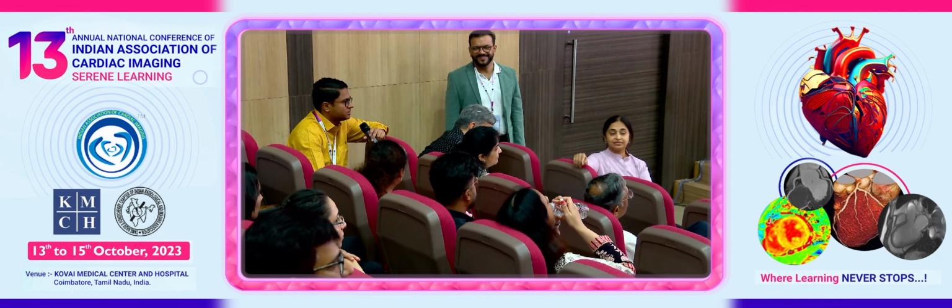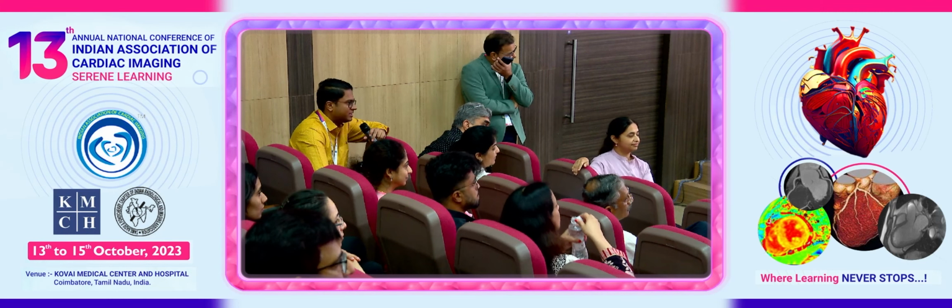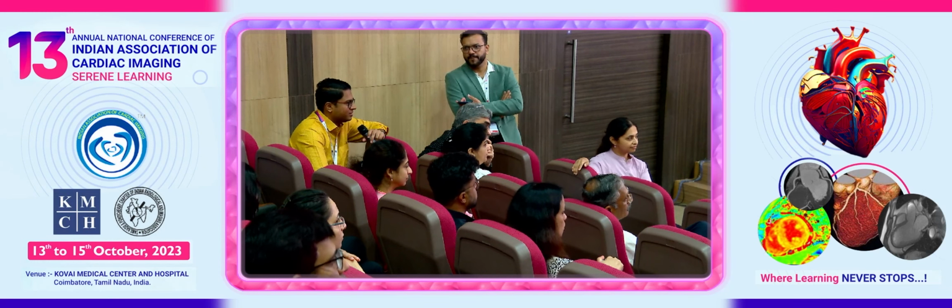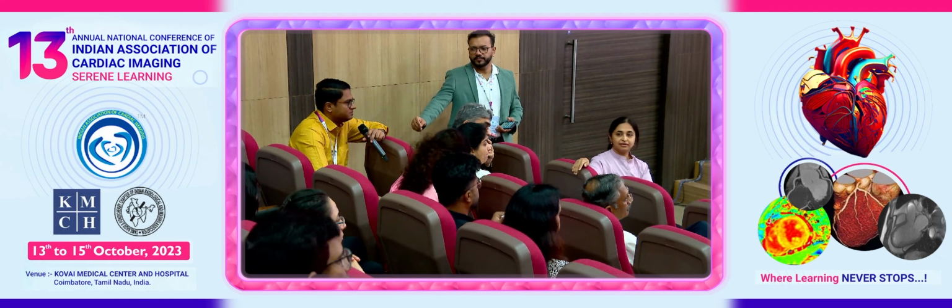I think the other problem is that they're using automated software. They don't realize what the centerline is. They don't have a basic understanding of reading. We, on the contrary, are reading from the base images. So that's where the problem comes. If you give it to any automated software, that's where it reads by itself.